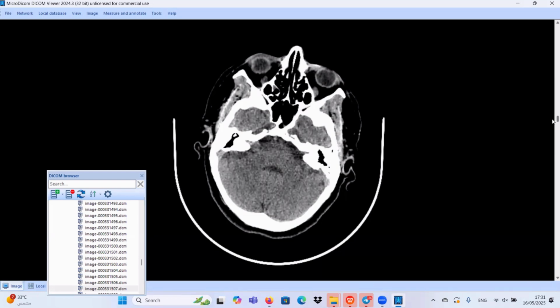So what's your differential diagnosis in this case? Sir, as I can see, there is mild extension into the porus acusticus. My first thought will be a schwannoma rather than a meningioma. But of course, I would like to have an MRI, contrast enhanced studies, to rule out further.